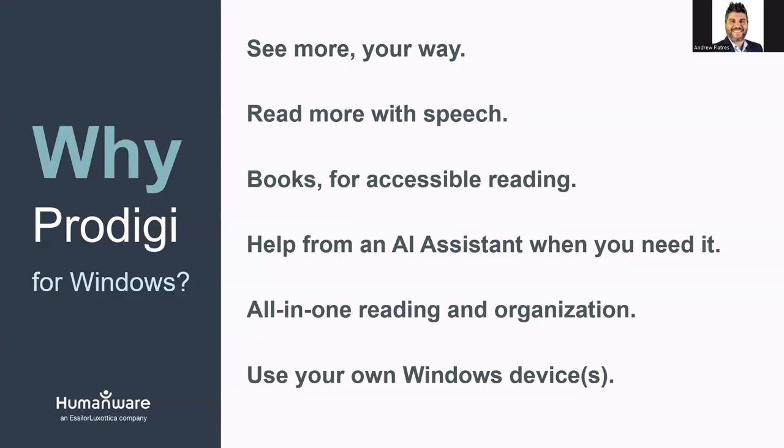We want you to be able to access books, to have an accessible reading experience. There is a books application in Prodigi that allows you to download books from supported libraries, as well as import content, and I'll show a new import functionality today that fits within our books application, so that you can listen to books being read aloud, or simply read them with adjustable text, changing the fonts, colors, and so forth to your needs. And another addition with this update is the ability to handle audiobooks within our books application.